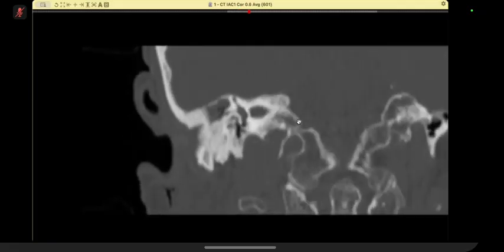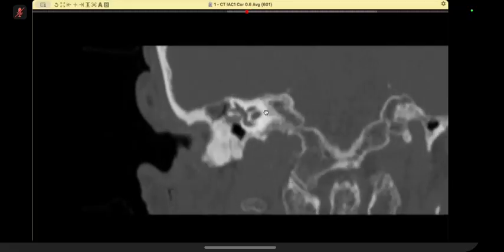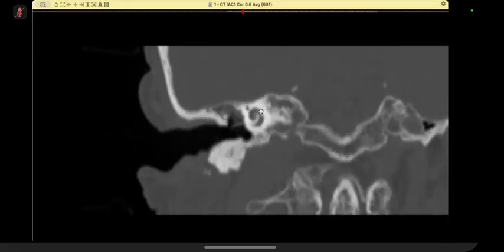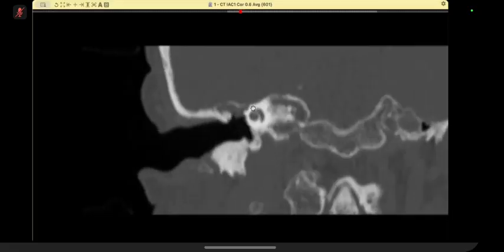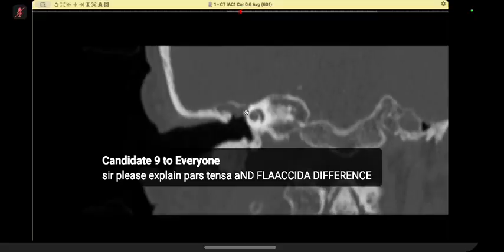Let's go and trace the facial nerve. So this is the internal auditory canal, and here this is the owl, labyrinthine portion. It goes here, and now you are convinced. Where are the two eyes of the owl? They are gone, and they are abutting this opacity. The two owls are gone. So this cholesteatoma is causing dehiscence of the facial nerve canal.